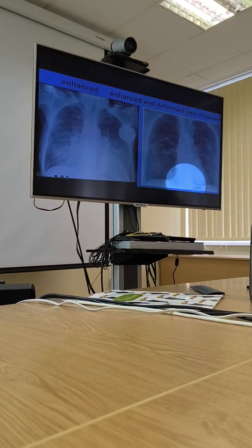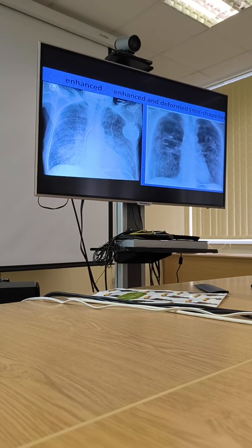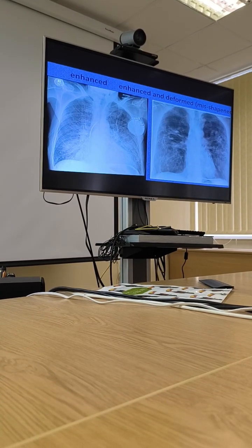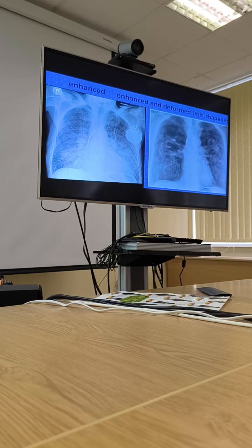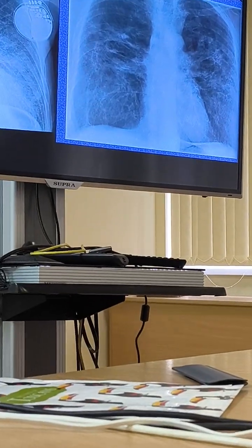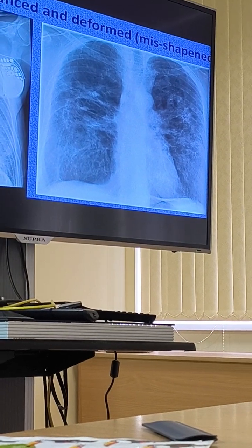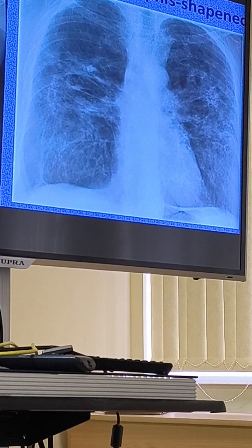And do you feel it's different? It's different. So can we describe this picture? What do we see there? Again, these markings are really bright, and we see more of them, but they are not only bright, they are really deformed, misshapen.